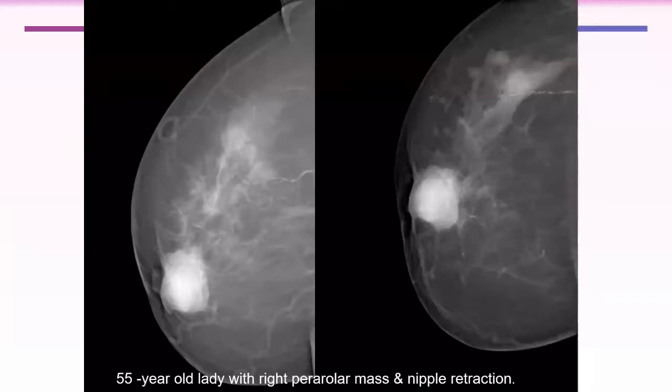Can you exclude lymph nodes in this image? Could we see the axilla? No, the axilla is not shown. Okay. So what about the rest? You know, is it a single mass?